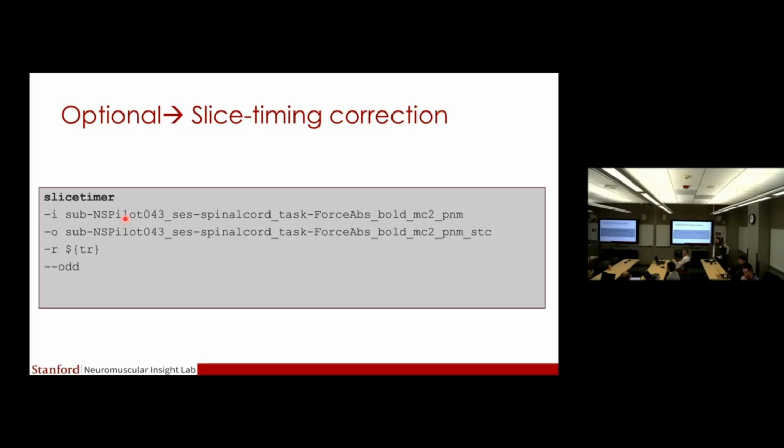That may be wrong, but I'm asking what can be a reason not to apply it? I think the reason might be that you are introducing interpolation after interpolation.